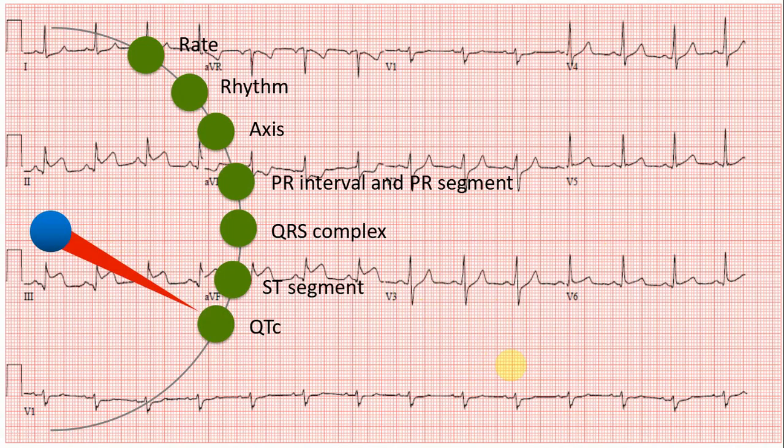So usually the QTC is 350 to 450 milliseconds. Usually we don't get very concerned if it is below 500. If the QTC is more than 500, they are at higher risk of torsades de pointes, right? So in this particular patient, I would say QTC is normal.